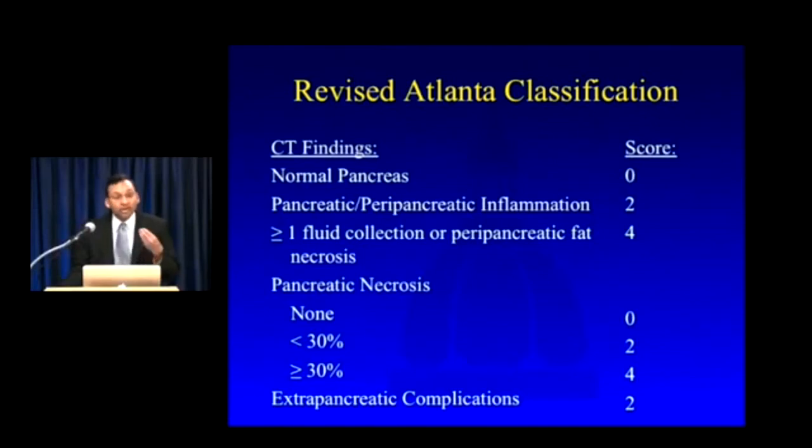But it is important to understand what kind of things it puts emphasis on, and specifically to understand its emphasis on the degree of pancreatic necrosis, a numerical emphasis. Notice that there's a great deal of importance in this system on the number 30%. So patients with more than 30% pancreatic necrosis are at especially higher risk of having a poor outcome. So it is important when you're looking at these CT scans and there is evidence of necrosis to judge whether it's greater than or less than 30%.